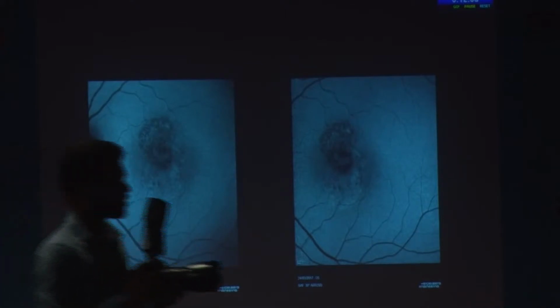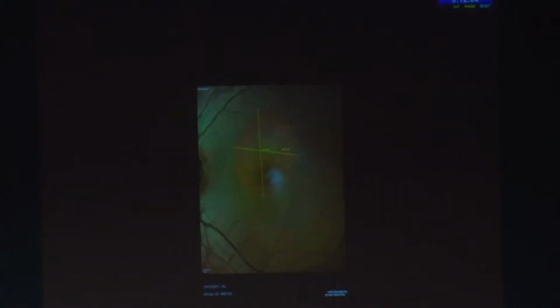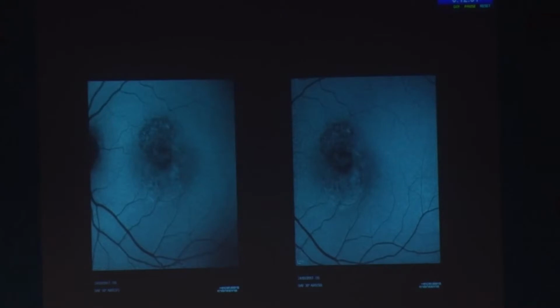So the basic tenet is that you never assess the patient based on one image. If you've trained yourself to understand that red does not necessarily mean a hemorrhage... Every picture from the Heidelberg is difficult for us, because we have to retrain our minds. This is pseudo color, yeah. Pseudo color imaging. One interesting thing, I'll just flip through the images. Larger lesion, smaller lesion. So you have a larger thing picked up on the multicolor imaging, and a much smaller thing picked up on the autofluorescence, which is quite an interesting finding over here.